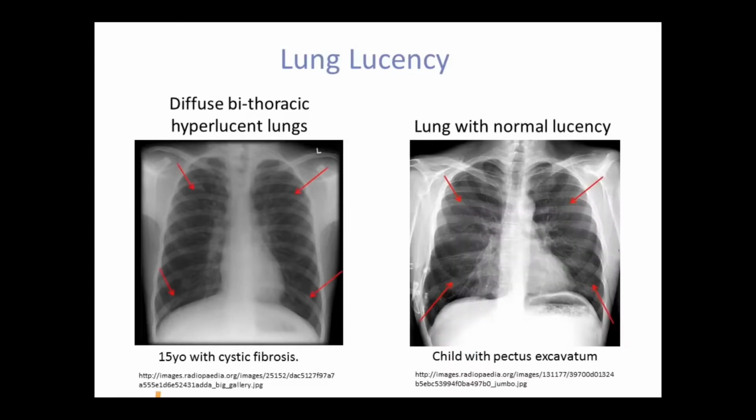All examinations of the lungs on chest X-ray should start by firstly looking at areas of differing lucency. The lung should appear black on most films. Normal lungs should include thin, white lung markings that extend almost to the periphery of the lung fields. Diffuse bilateral increased translucency may be present in a well patient who has taken a bigger breath or with overexposure of the film, but may also be observed in patients with asthma, bronchiolitis, cystic fibrosis, or an upper airway obstruction.